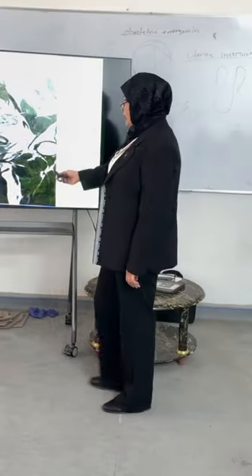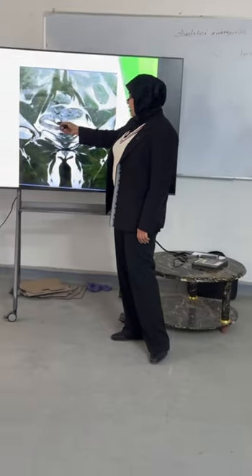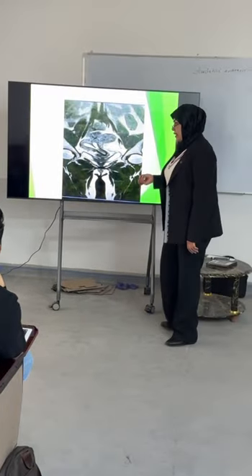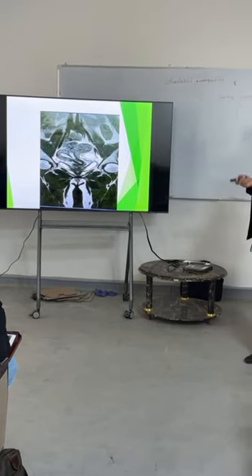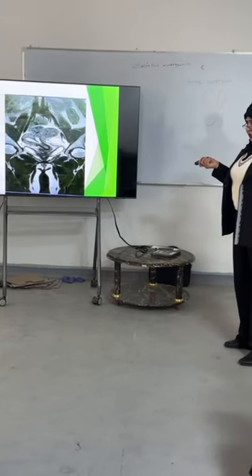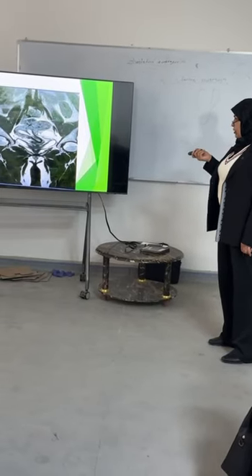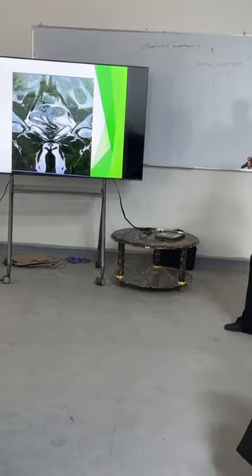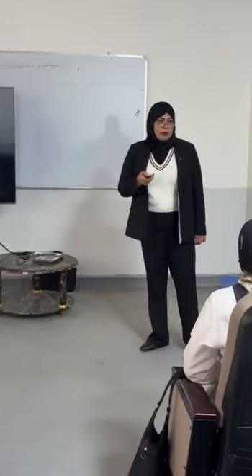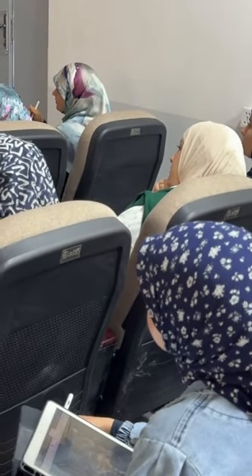So here, the endometrium is very rich with blood vessels, so it appears as a hyperintense structure. And now we are with MRI of the pelvic region, T2-weighted, show us what?